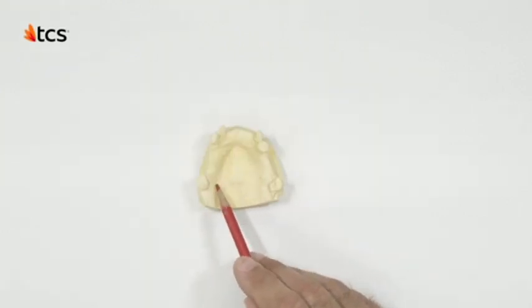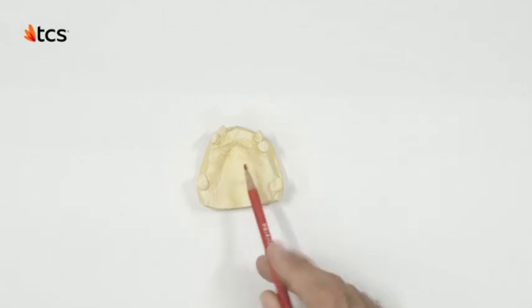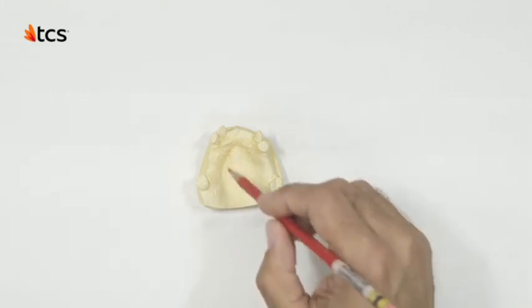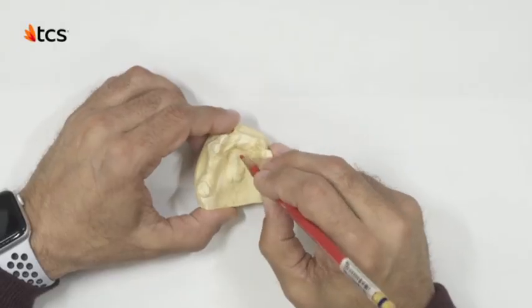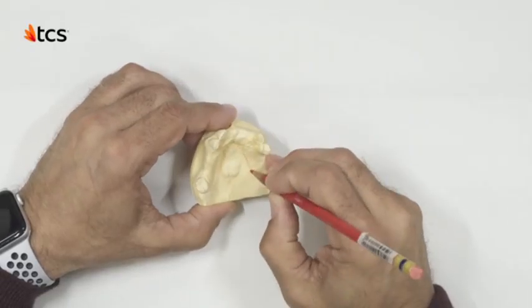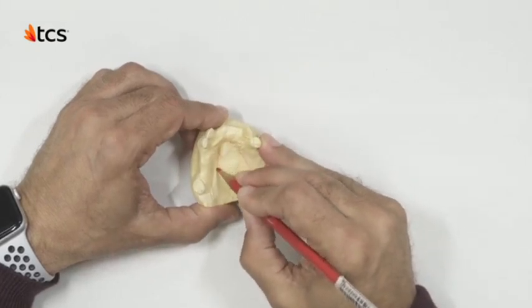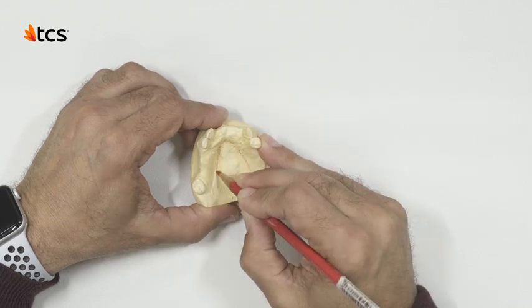Additionally, notice that the impression shows an existing palatal seal. This indicates that the patient has worn a metal frame partial for some time. In this case, it is best to follow the same design for two reasons. One, the patient is already accustomed to this design and amount of coverage. And two, there is a hard bone area here, so avoiding this section will minimize potential discomfort to the patient.